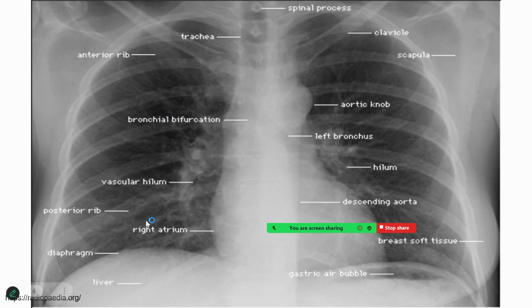In a chest X-ray, only in the medial two thirds will you be able to see them. Beyond that, that would be abnormal. So, a normal X-ray would show you only that. Hilar areas would have many lymph nodes, and normally these lymph nodes are not opaque and you will not be able to see them in large numbers in the X-ray. But of course, a few of the lymph nodes may be visible, and one or two of the lymph nodes being calcified is not an important issue.